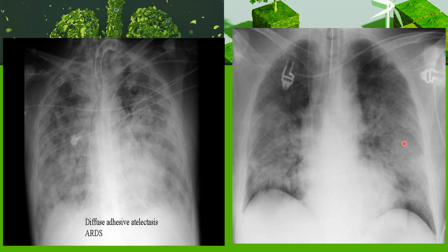You can see here, as we saw before, cardiogenic pulmonary edema shows smooth, symmetrical opacities, fluffy, cotton-ball, cotton-like. In cases of non-cardiogenic pulmonary edema, acute lung injury, ARDS, permeability edema, you can see opacities all around the upper, middle and lower zones, and some patchy opacities, discrete and patchy. They are not very symmetrical in contrast to here.